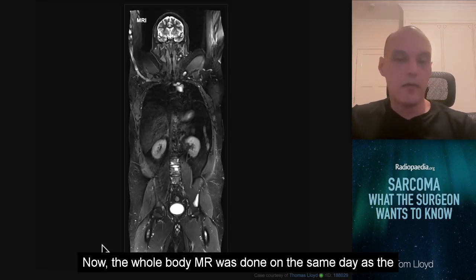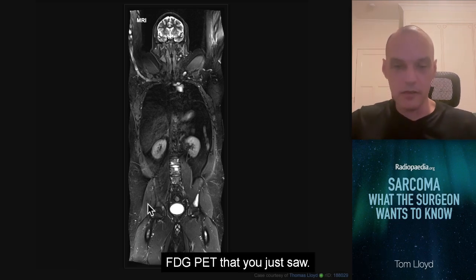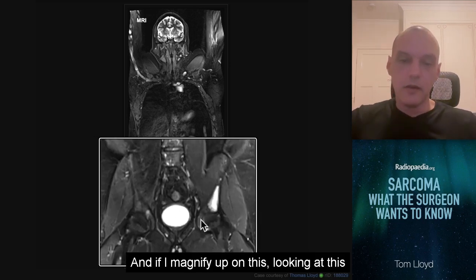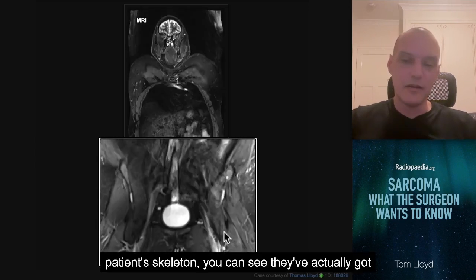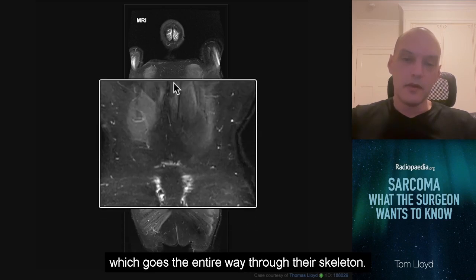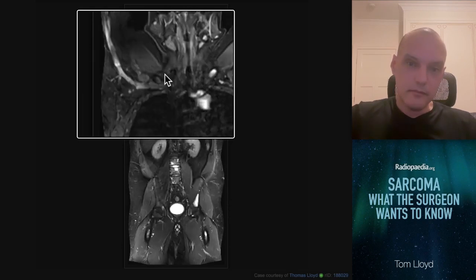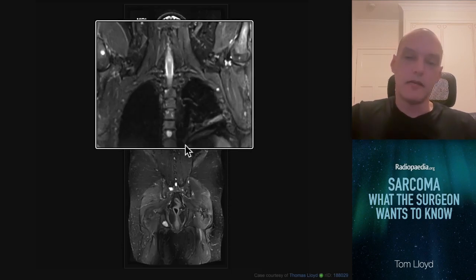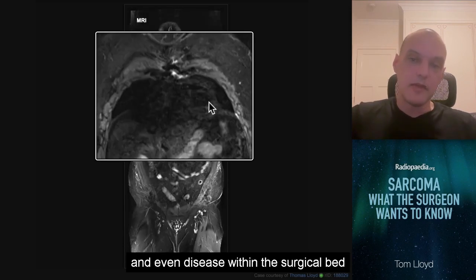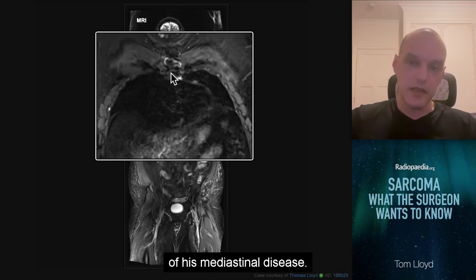Now, the whole body MR was done on the same day as the FDG PET that you just saw. And if I magnify up on this, looking at this patient's skeleton, you can see they've actually got extensive bony disease, which goes the entire way through their skeleton. None of it lit up on the PET scan. See spinal disease and even disease within the surgical bed where he's just recently had his sternotomy for removal of his mediastinal disease.